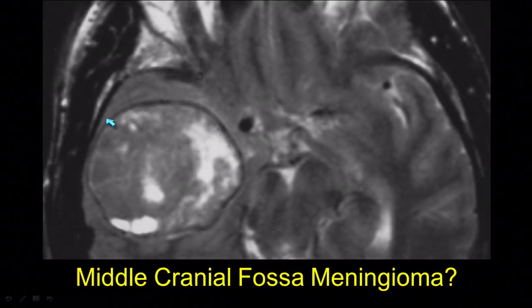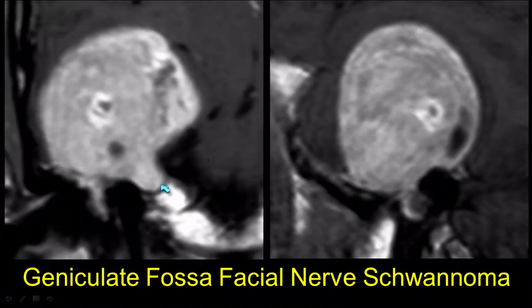Here's a larger lesion. This case was thought to be a meningioma. It looks like an extra-axial mass. It's benignly compressing and displacing the brain. It looks like it has a good CSF vascular cleft between the lesion and the brain itself. But what they didn't notice was this is actually arising from the geniculate ganglion down here inferiorly. And you can see the swirling Antoni A and B fibers within the lesion.